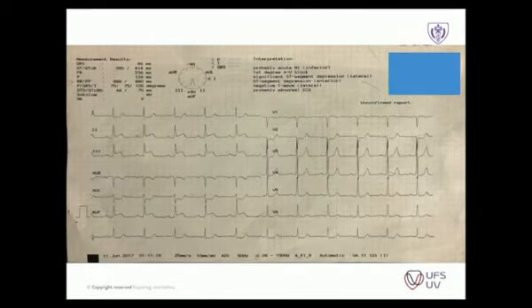When the patient arrived at Universitas Hospital, the ECG was repeated, and here we clearly saw that he had an inferior myocardial infarction. On this ECG, it's striking that all the other abnormal ST segments, especially in the chest leads, have now disappeared, and he has elevated ST segments in 2, 3 and AVF, representing an inferior myocardial infarction.